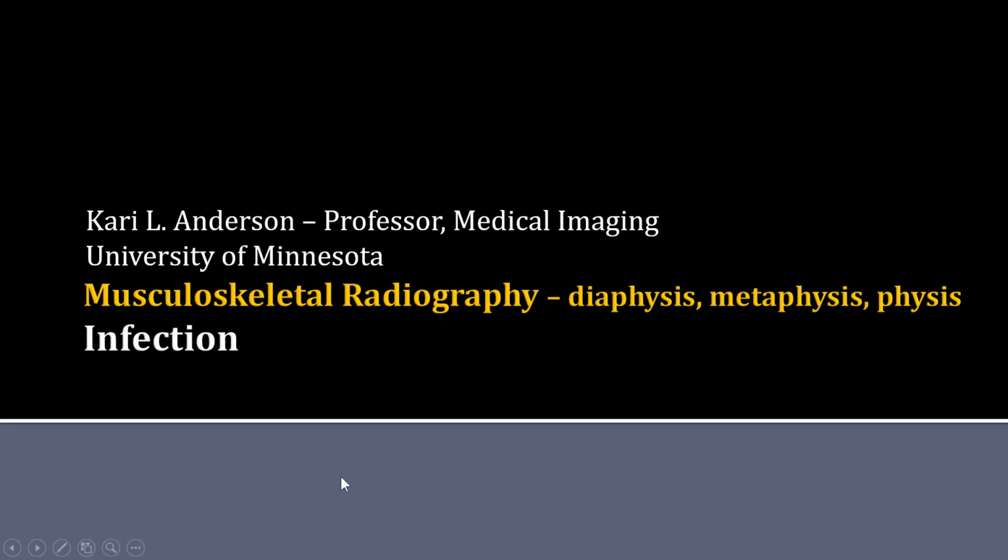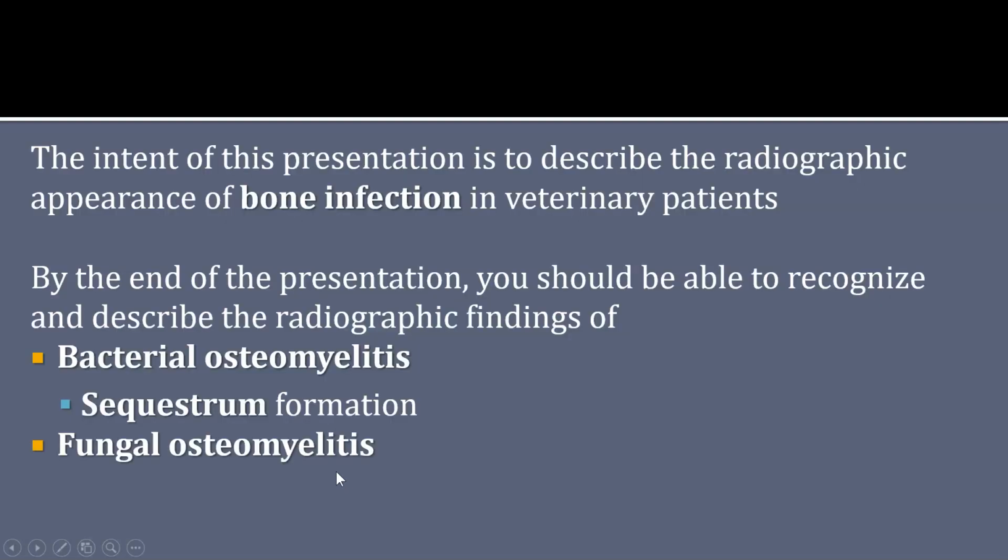This is the third in a series of presentations on the topic of disorders predominantly affecting the diaphysis, metaphysis, and physis in our veterinary patients. This presentation is going to talk about the radiographic appearance of bone infection, and by the end of the presentation, I want you to be able to recognize and describe the radiographic findings of bacterial osteomyelitis and fungal osteomyelitis.